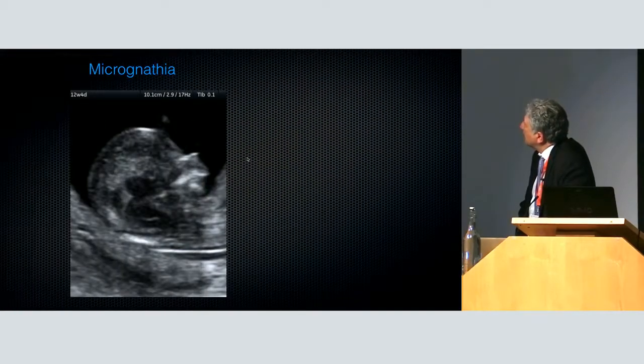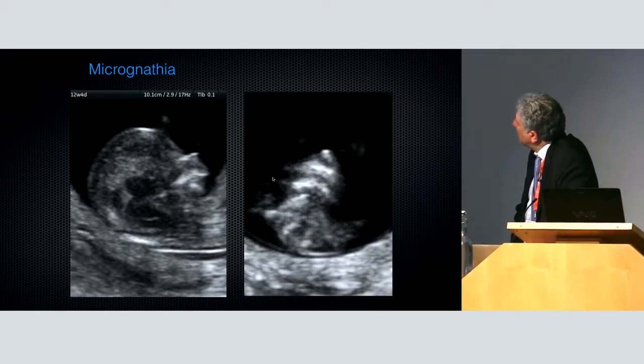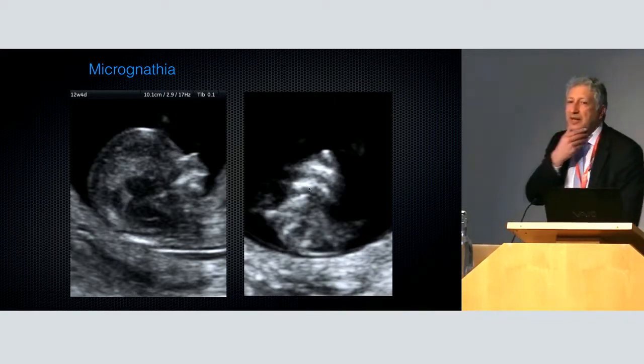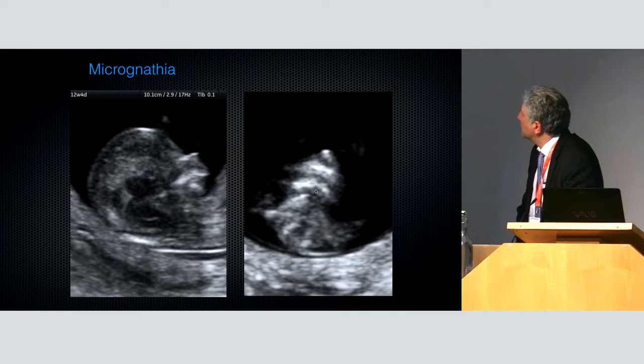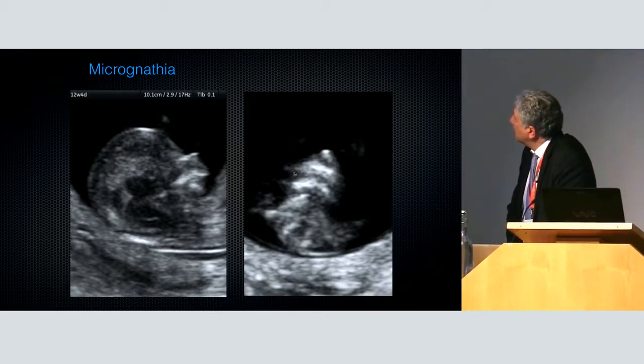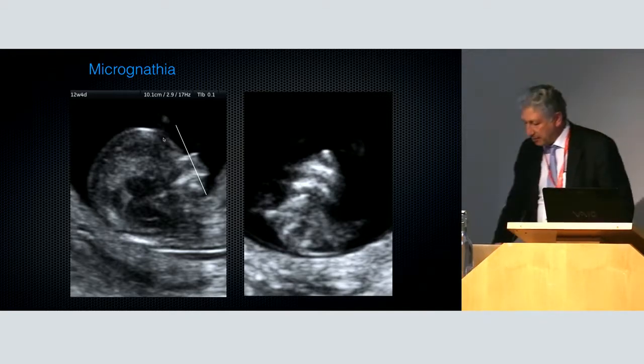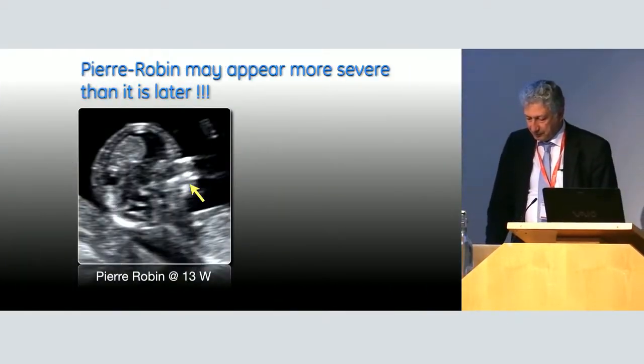If you have retrognathia, the line where you will see the nasal bone with the processus maxillaris is just anterior to this part, and then you don't see the gap because it is behind the line. So the absence of the mandibular gap is for him a sign of retrognathia. That means you are confirming in a way this approach, and he showed us that the line may be of importance, and the idea was taken by the group here from Tübingen, where they showed that you can use this line as well to measure a distance, because this is a kind of impression, and this is the paper.